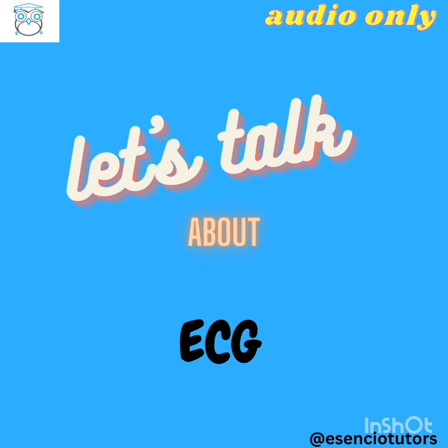What about the T wave? Okay, T wave is okay. Generally, if I want to know if the T wave is tall or not, I can just compare it with what? The P wave. The T wave should be approximately twice the P wave. Can you see that? If it's way taller, then you are dealing with a peaked T wave. But this is pretty good.